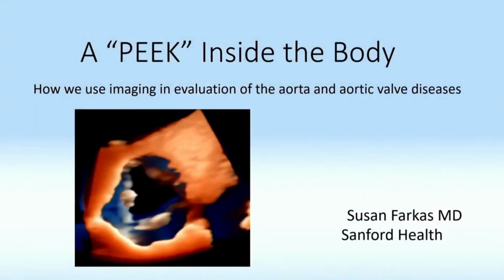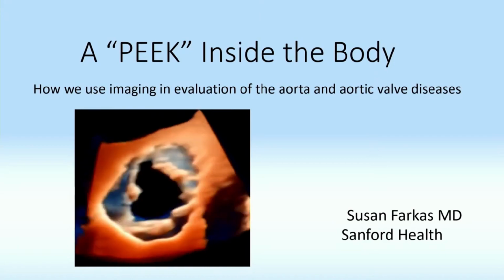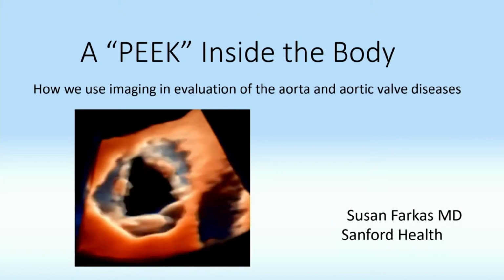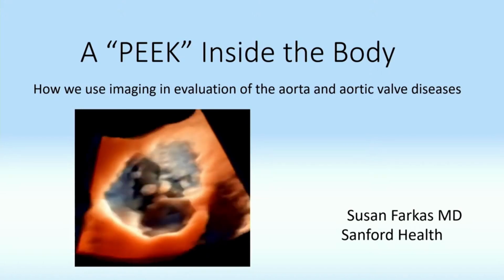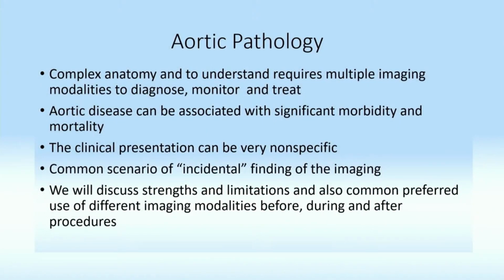And what you can see here is what you've seen before. This is the aortic valve, and this is it opening and closing, the 3 leaflets, and this is a 3-dimensional view. Before I continue, I'd like to say that I don't have any disclosures, but I'd like to thank our team and also Zach Ketchum, who helped to put together these images, which are all our own images from our lab.